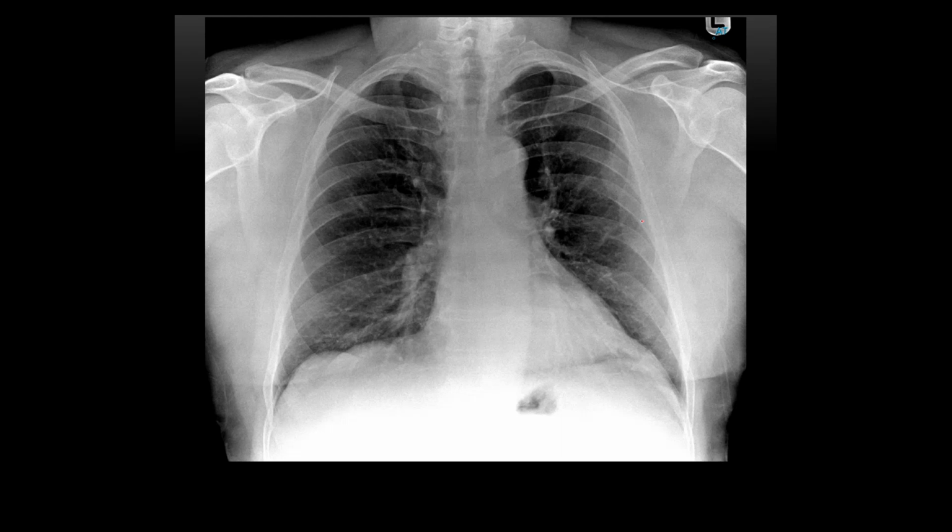Finally, this is one I reported today. I thought I'd chuck it in because it's a subtle one. It's a good teaching point. You can see the quality of that X-ray is not the greatest, is it? You can see how dark the lungs look. When you get really dark lungs, it could be one of two things. It could be that they've got hyperlucent lungs because they've got COPD, or it could just be the exposure. I think this one's more the exposure.